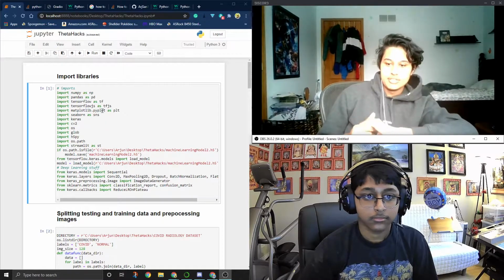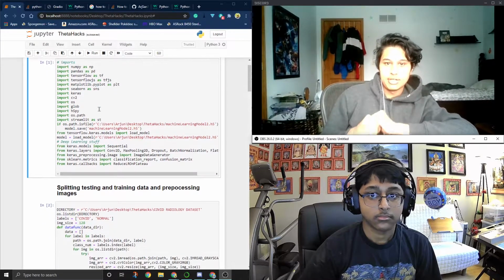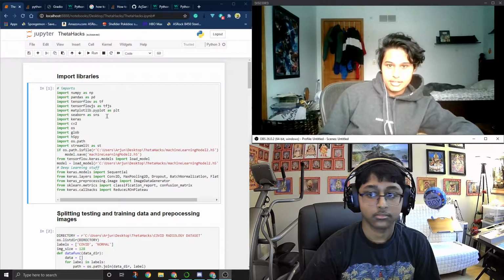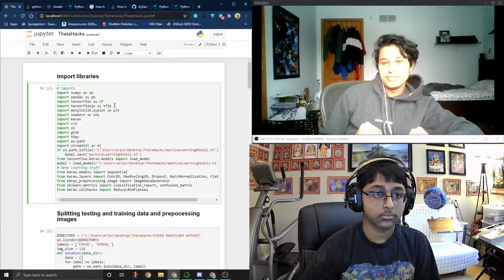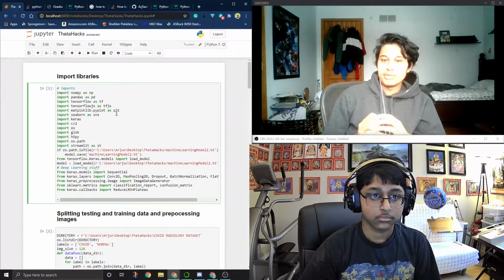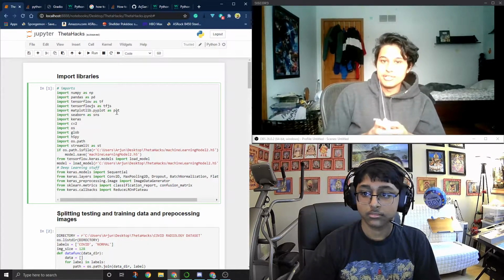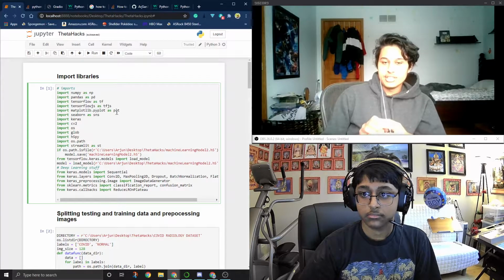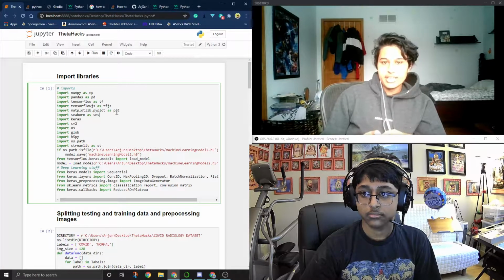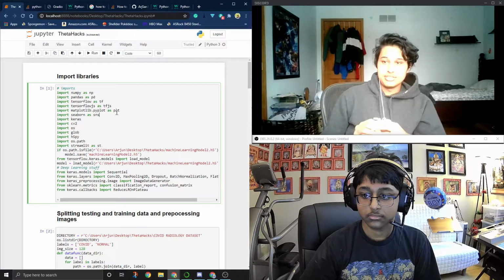Today we're just going to be giving you a quick run through and demonstration on the program that we've created. Firstly, our program is actually a COVID X-ray classifier such that if you input a COVID X-ray image or a normal X-ray image, it will return the probability of that X-ray image having COVID or not having COVID. And this has great applications in the hospital as currently they are overloaded with work, and implementing a system like this will allow nurses to not have to manually scrape through hundreds of files at a time.